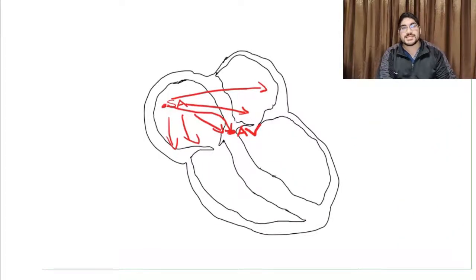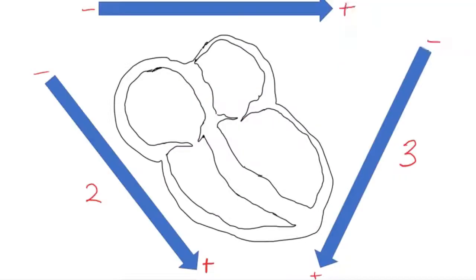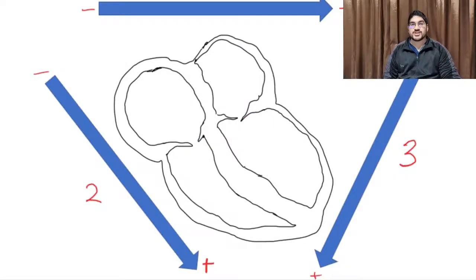Question 2 is, is the P-wave upright in standard lead 2? Because if the P-wave is upright, then you can confidently say that the pacemaker for the heart is located somewhere in the atria. And so we're going to take a slight tangent here to talk about exactly what up and down mean in the context of an ECG. If an impulse goes up in a particular lead, it means it's coming towards you in that lead. If it goes down, it means it's traveling away from you. So that means you need to know what direction the leads are actually facing.